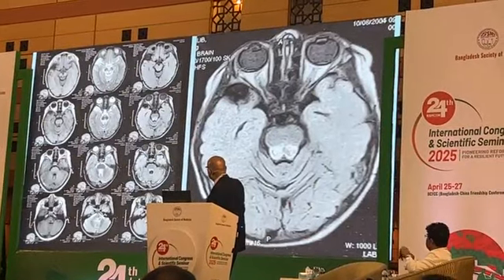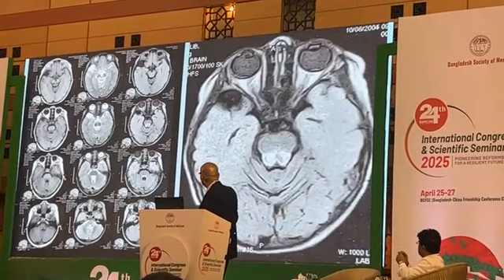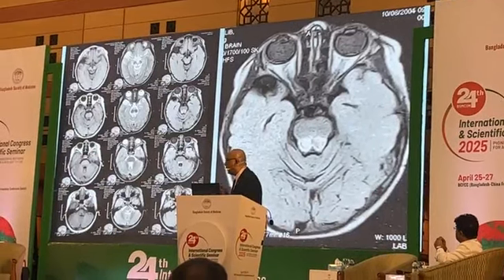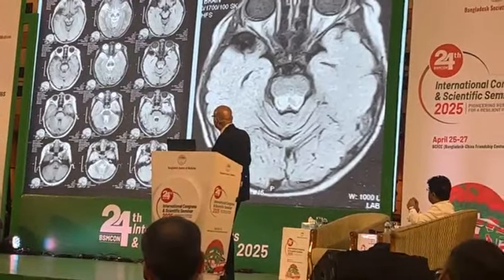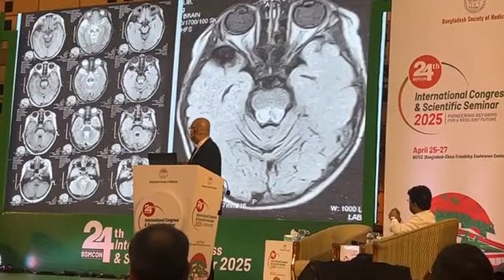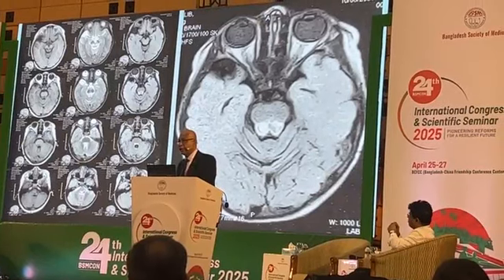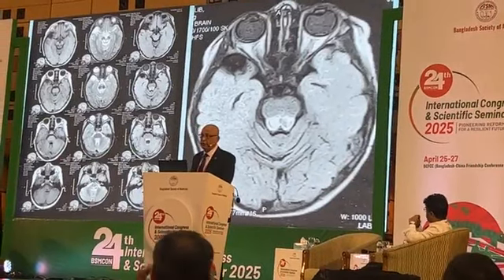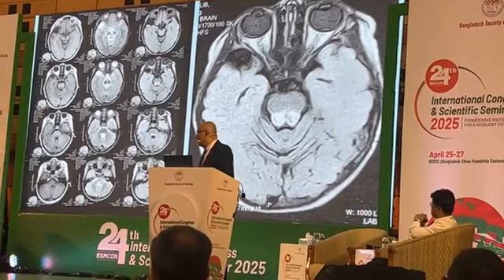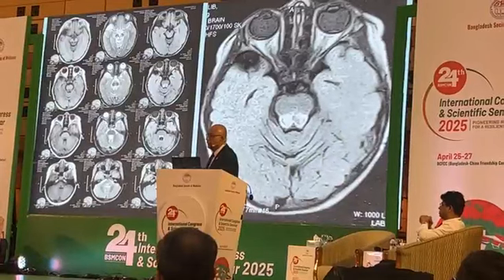Right. This is the midbrain, T1 hypointense, T2 and FLAIR hyperintense. In the posterior part of the midbrain, there is a white lesion, symmetrically bilateral. This site is called the tectal plate. So, demyelination or white lesion in the tectal plate. This is again a site for extrapontine myelinolysis, but also of toxic demyelination, and also of hypoxic ischemic demyelination.